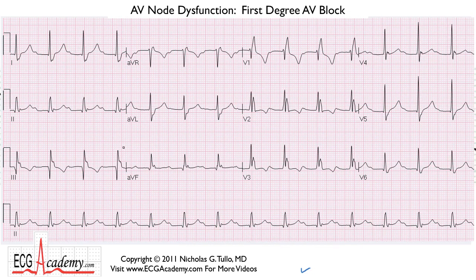Now here's a little bit more of a complicated electrocardiogram, and we're not going to get involved too much with the QRS complexes and what it shows. Just for you newbies, this is an example of a right bundle branch block, but we're going to cover that in the intermediate course going over 12 lead ECGs. But for now, let's concentrate on the rhythm.